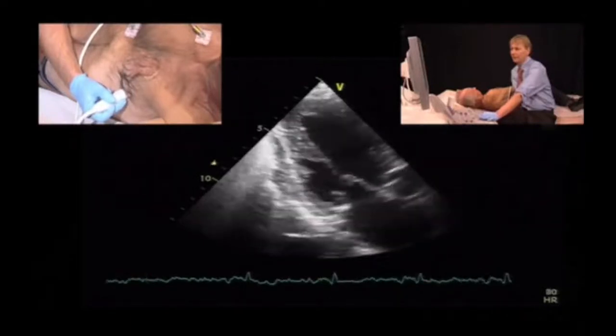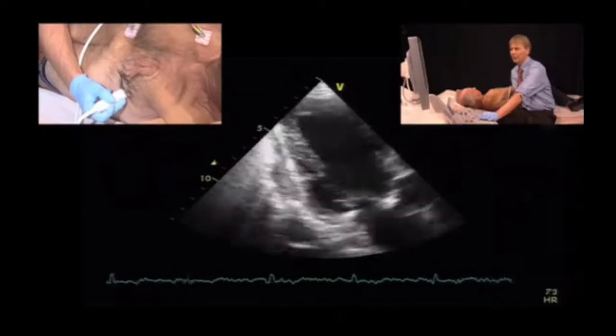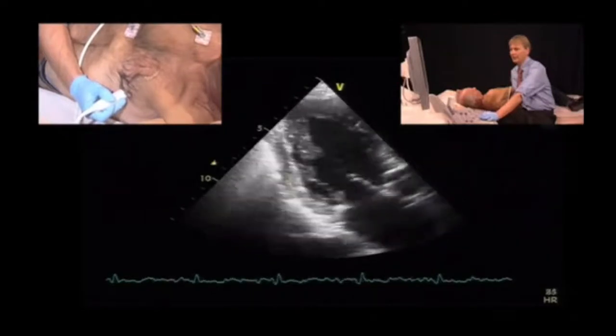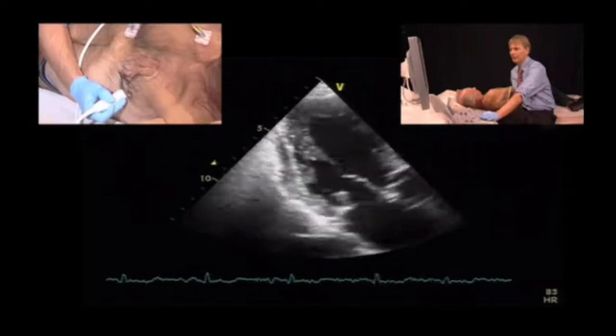You always have to watch out. The papillary muscle obviously is still moving, but the scar seems to go all the way up to here. So this is all scar and akinesis. And there also seems to be some degree of dyskinesia of the posterolateral wall.